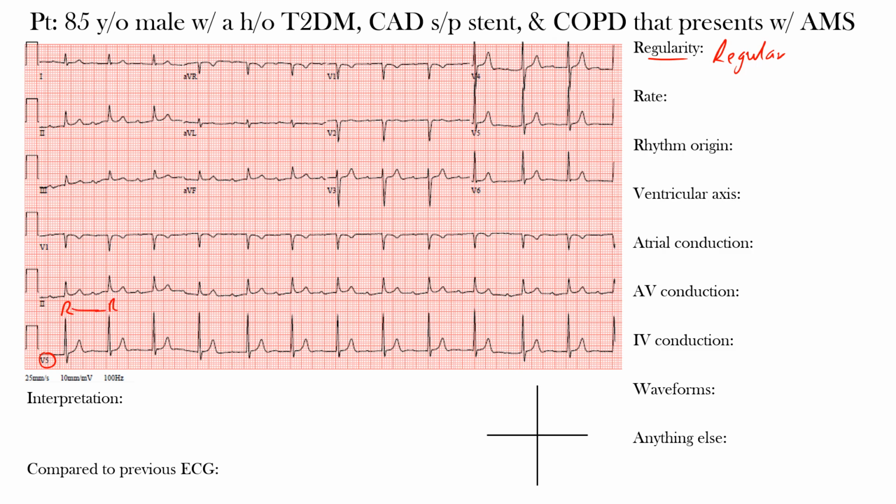Remember, the R wave is the first positive deflection after a P wave, and this R wave to R wave is called the R to R interval. And we want these intervals to be consistent throughout, meaning that we want this R to R interval to be similar to the one that follows it. So from this wave to the next one, we want these distances between to be the same, and the same thing of the one that follows. So all of these, if you were to measure out all these R to R intervals between all of these different R waves, they would all be the same throughout. So because of that, that's what we call a regular rhythm.